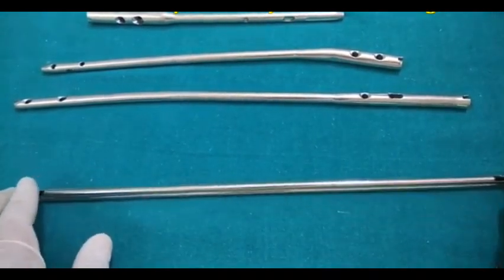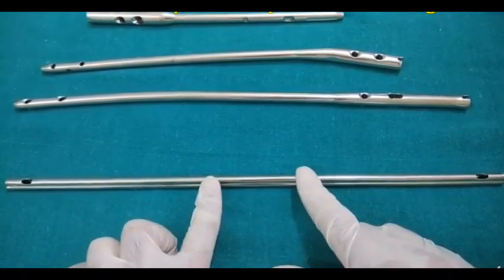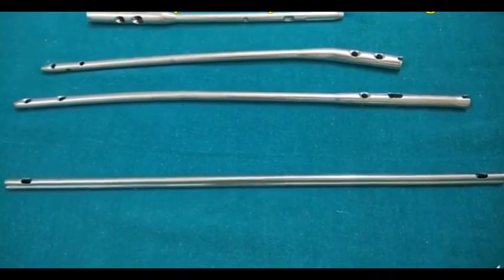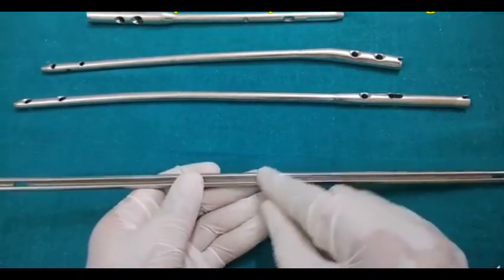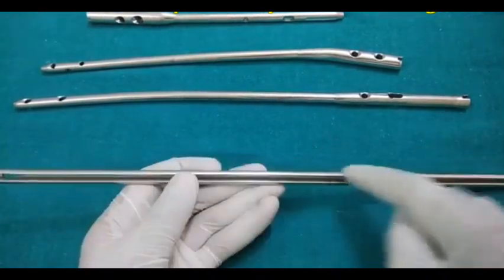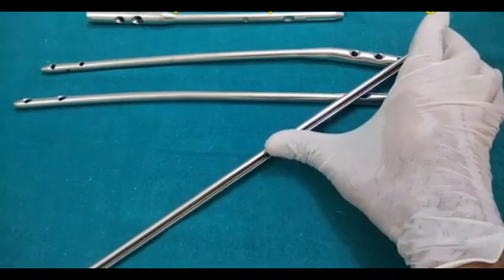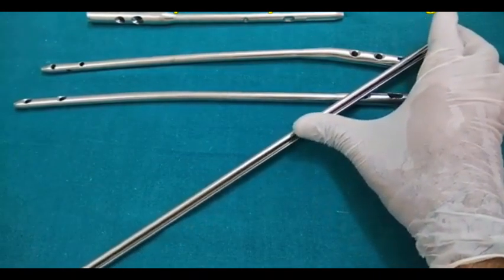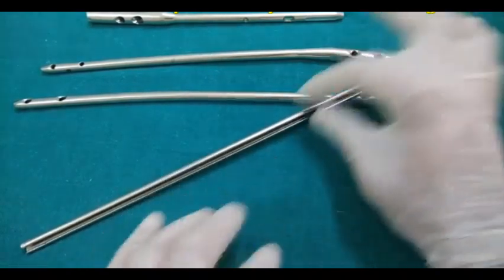And another question they usually ask is, if you have the 8 mm size nail and the diameter you need is the 9 mm nail, and you do not have the 9 mm nail on the table, then what will you do? So you can combine the 8 mm nail through this slot. You can combine the 2 nails. I don't have the second nail, but you can combine the 2 nails, and now the effective diameter will be 9 mm. So that is how you can increase the size by one by combining the 2 K nails.